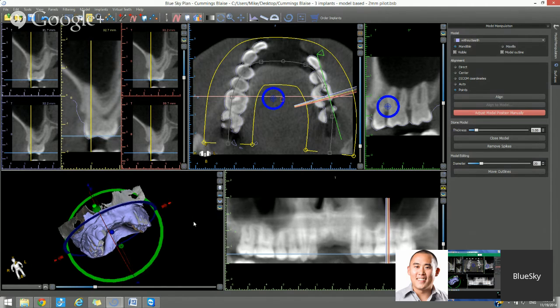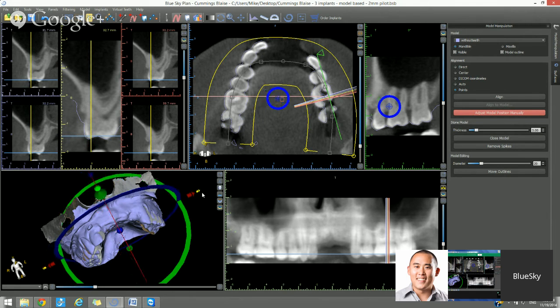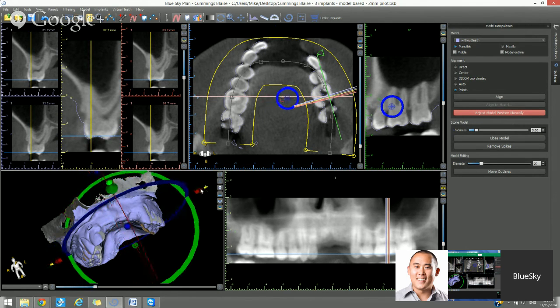We also have some other more advanced importation functionality that allows you, first of all, to change the point of rotation. Right now it rotates around the middle. When you use the green circle, it will rotate around the middle of the model. If you use the little arrows, then you can move the whole widget over and change the point of rotation. So if one side is properly aligned, then you can rotate it around that side and just have a different axle of rotation.